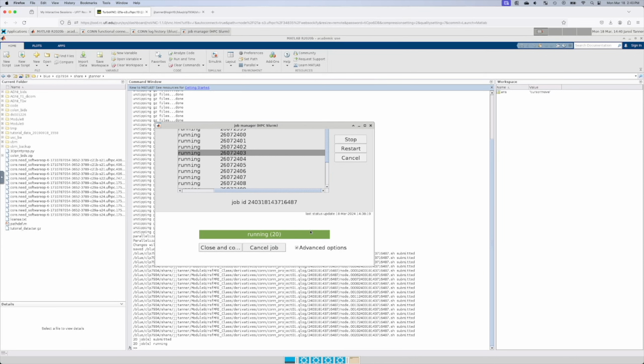I can't estimate. We'll just say this is going to take an hour to finish. It could be a couple hours. It could be many hours for this to finish. It just depends on the processing. So again, be patient, and we'll see you in a while.